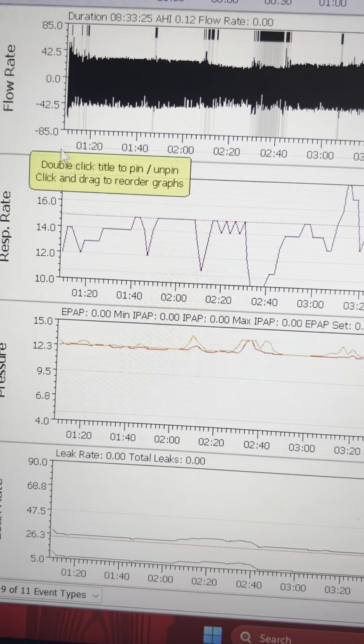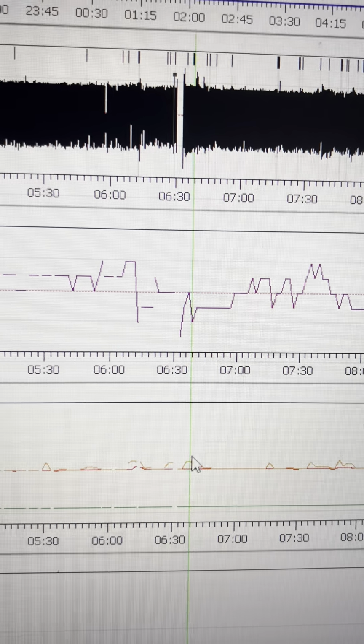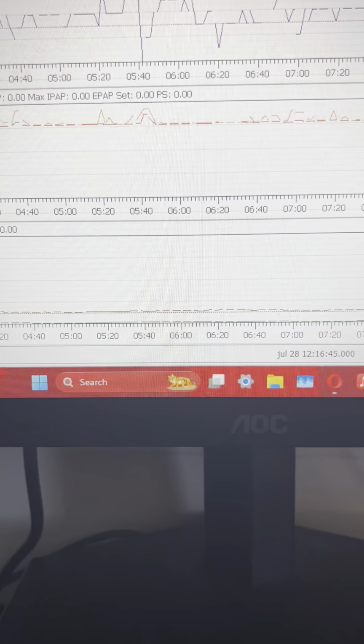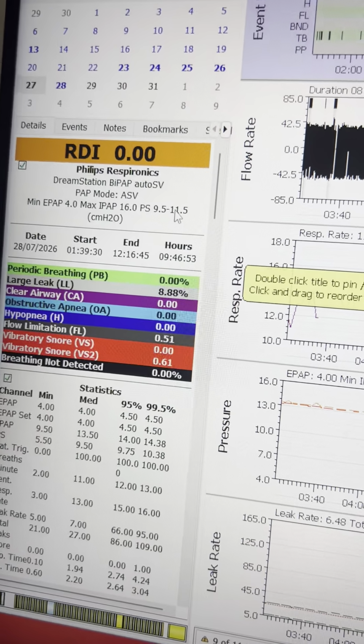Also, I don't know why it's so broken, by the way. It's a really weird bug, but here you can see it only went to 9.5 here. Is it? Yeah, and so on. So barely any. The day before it did go up a bit more, so right here, but it never reached the peak of the total spike of 11.5.